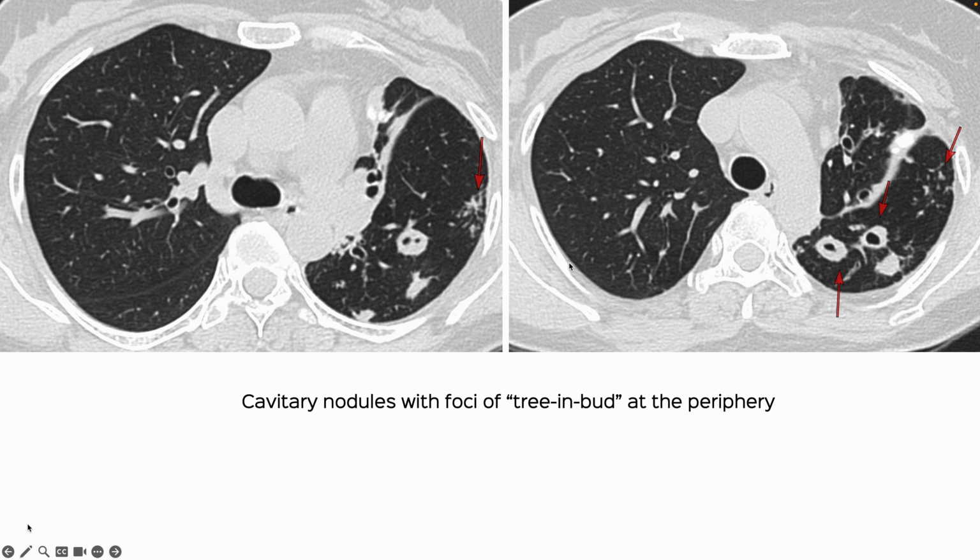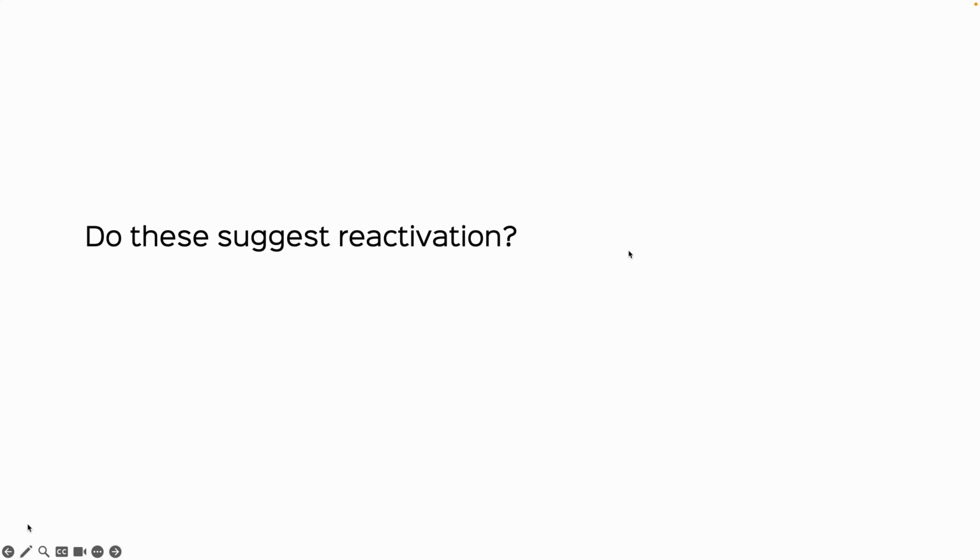Now, the patient also has these cavitary nodules, areas of tree and bud. And the question that arises is, are these just part of the old TB or do they represent reactivation of TB, especially when we don't have any old scans to compare with?